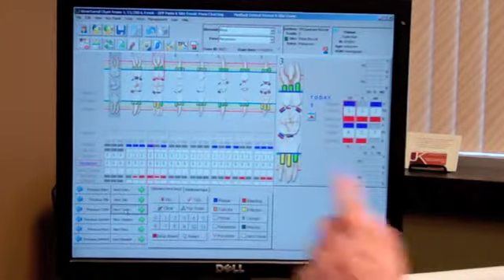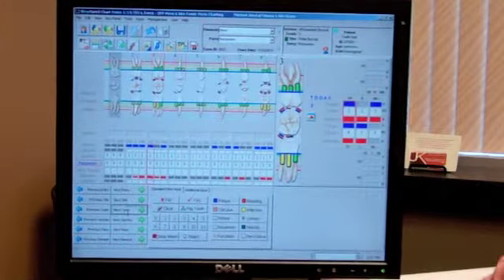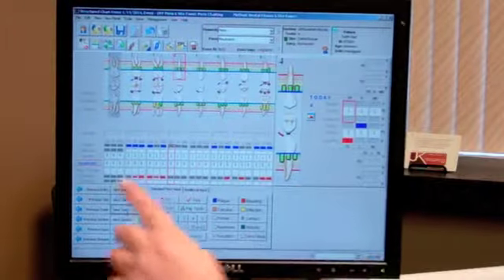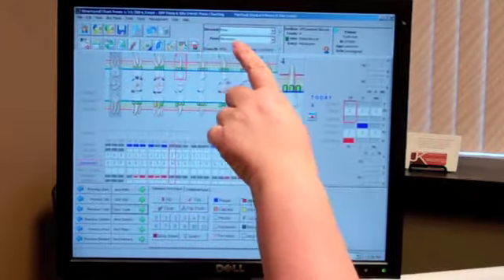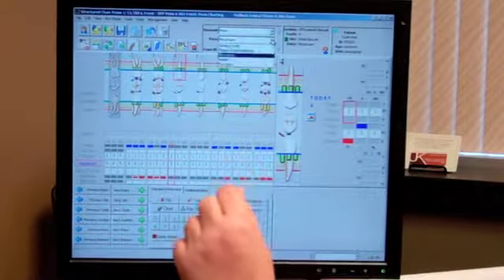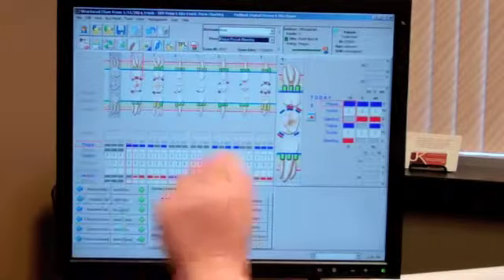You want to click on it? Yep. Then it'll bring you to 3, but I want to go to tooth number 4, so I would say next tooth again, and that would bring me to tooth number 4. Now if I needed a different site, one thing to check is what pass you're under. If it says recession, it's not going to chart anything with plaque, pocket, or bleeding, so you do need to make sure it's on plaque, pocket, and bleeding, and there that will be highlighted.